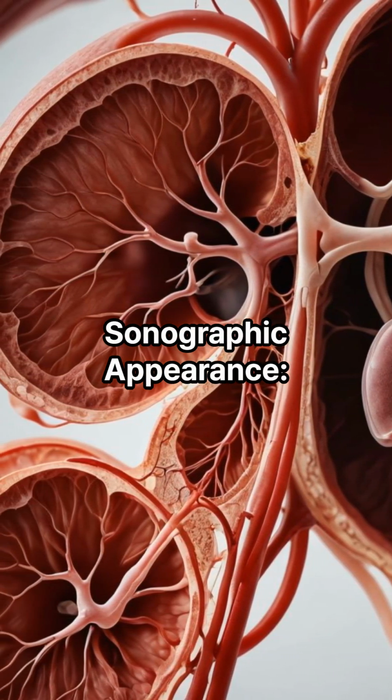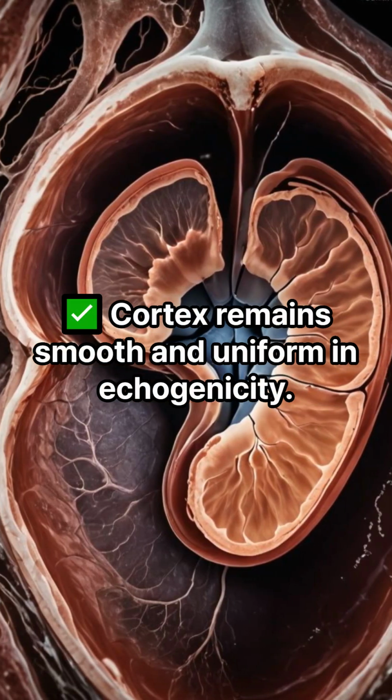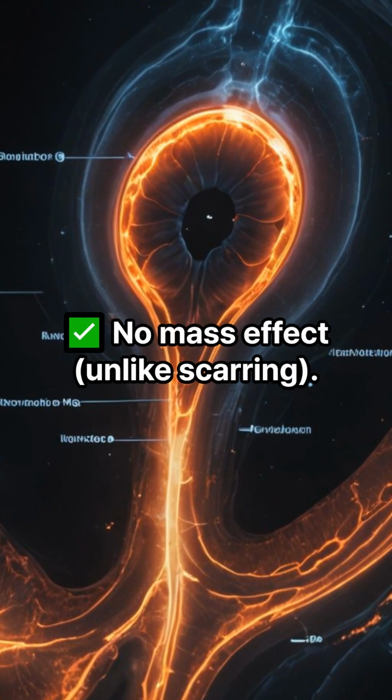Sonographic appearance. Scalloped, lobulated contour of the kidney. Cortex remains smooth and uniform in echogenicity. No mass effect, unlike scarring.